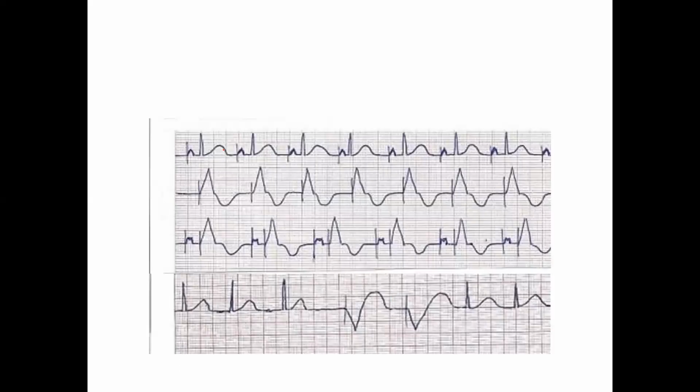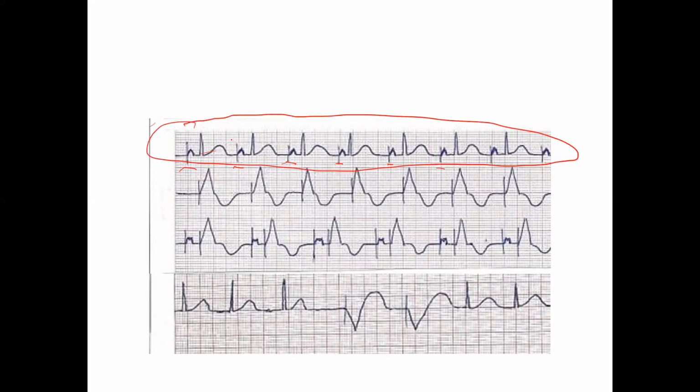Okay, let's practice these. Pacemaker spikes. Again, you have to recognize that on EKG. These are not QRSs, right? Sometimes they look like that. So which one is this? Please tell me. I'll give you 5 seconds. What is this pacemaker? Atrial pacemaker. Fixed or demand? Fixed. Yeah, you have to say fixed. So the next one is a fixed ventricular.